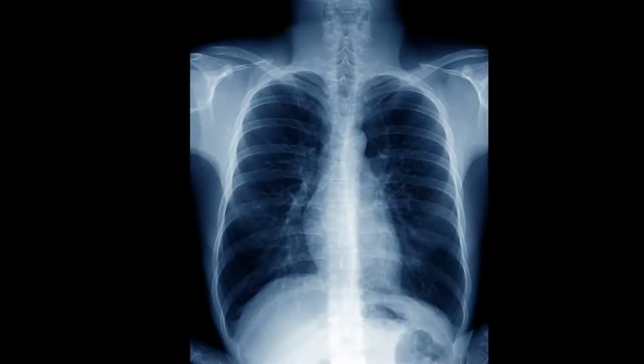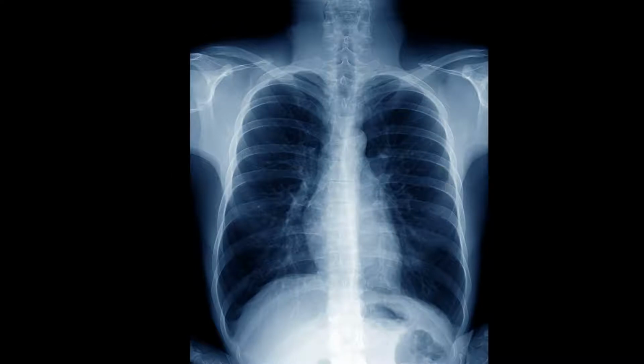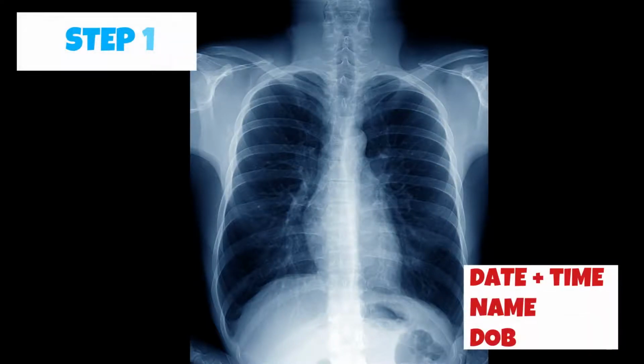The first step in interpreting a chest x-ray is to be able to identify the details of the patient. This seems very basic, but being able to identify the date, the time, the name of the patient correctly and demonstrating to the examiner that you recognize the demographic details of the film are consistent with that of your patient.